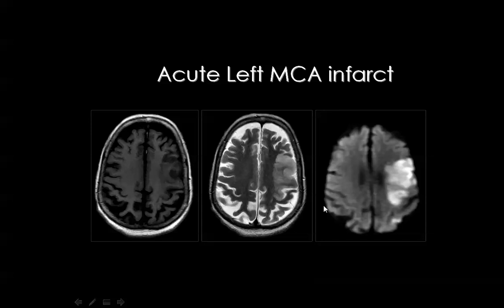Then in this MRI, you can see an infarction here, which in any MRI will appear black in the T1 and bright in the T2. But in order to see the exact distribution of the infarcted area and to see whether there are other infarctions that cannot be seen in the T1 and T2 weighted images, you should have the diffusion weighted images.